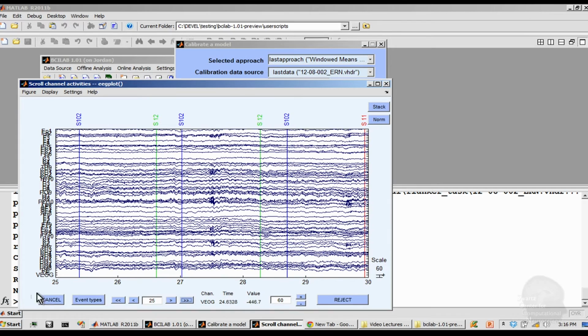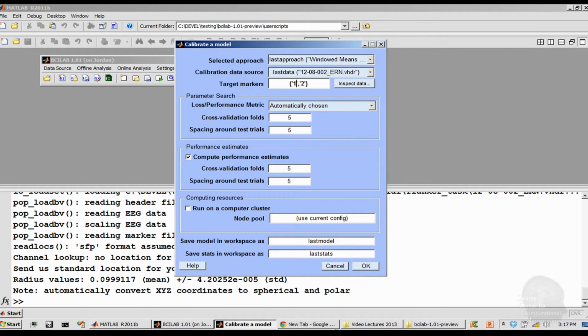And as I'm looking at this, I just remember how this was specified. There's 2 markers for errors and 2 markers for non-errors. And it's left-hand errors, right-hand errors, and left-hand no errors, right-hand no errors. So basically, there's 2 groups of markers. And each group defines a class, an output value, or a desired outcome of the BCI, or desired output. So this is a special grammar here, or syntax, in which you type in markers in marker groups. By default, it'll just take the first string and assign it a 1. The next string, it'll assign a 2, and so on as a value.